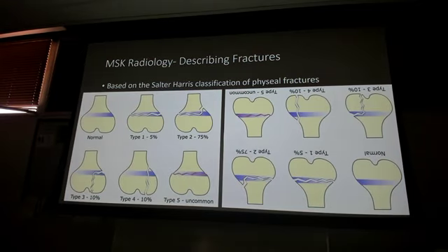Okay, buckle in. Salter-Harris fractures. You will see this again in ortho. Promise you, you will see it again in pediatrics. I have it flipped upside down for one main reason. Which way is the x-ray gonna be presented? Like this, right? Is the joint down here?